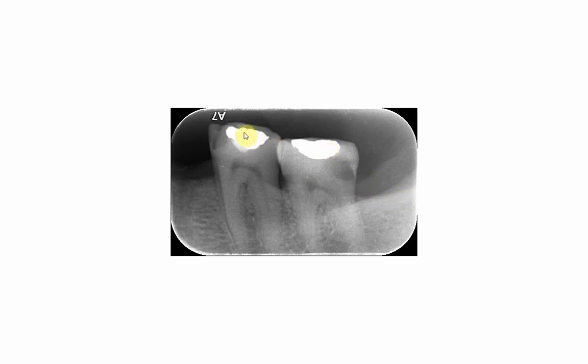Another thing I want you to have a look at: compare the radio opacity of amalgam over here in the lower 6 to this radio opacity over here. Now you see there are two different radio opacities. One is very radio opaque, which is that of the amalgam, and the other, just beneath it, has a lesser radio opacity. This is the liner, the material of which is zinc phosphate cement, which is usually used as a liner with amalgam.